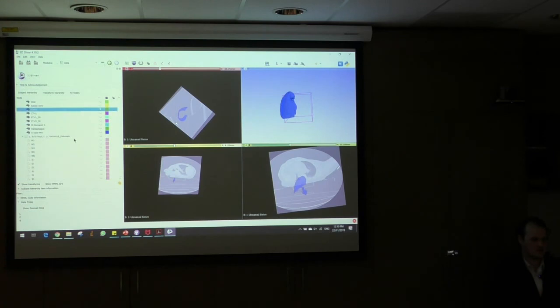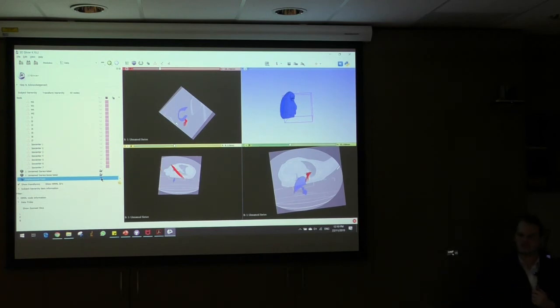But then from here, it'll come up as a displacement function down here in the field, and it will tell you what has been displaced, for instance. And you're able to do this for various different structures as well. You can do this for your RT dose structure, and essentially what that allows you to do is shift your literal beam setup, almost distorting your treatment plan, and do a comparison between the two if that's something which you want to do.